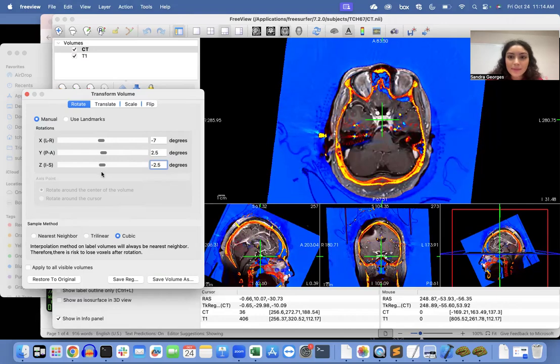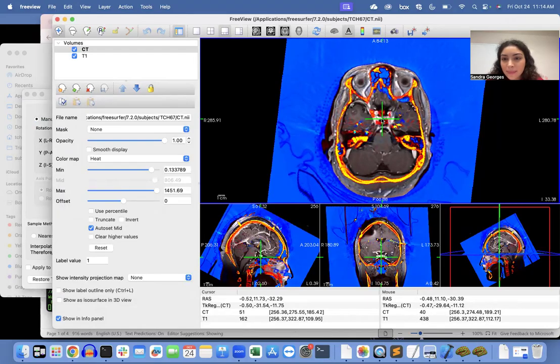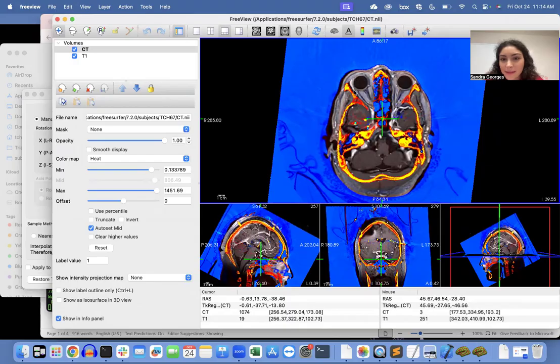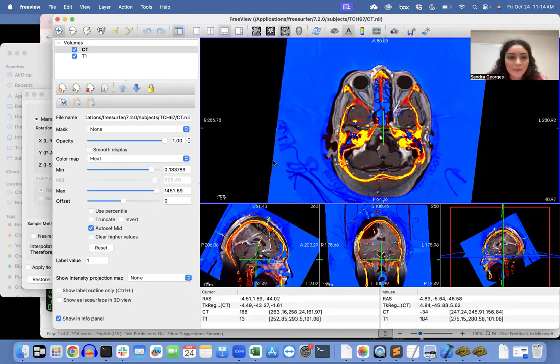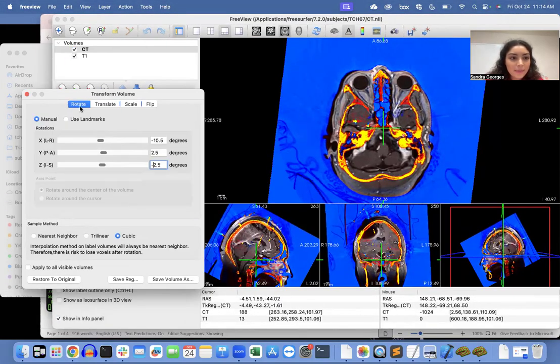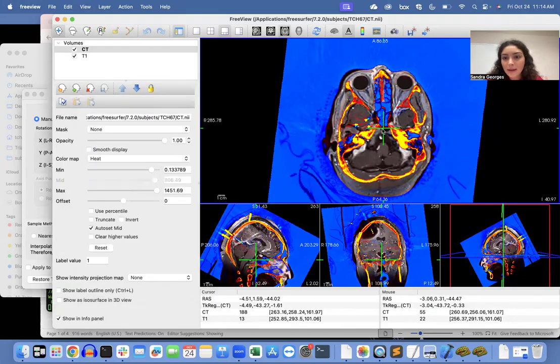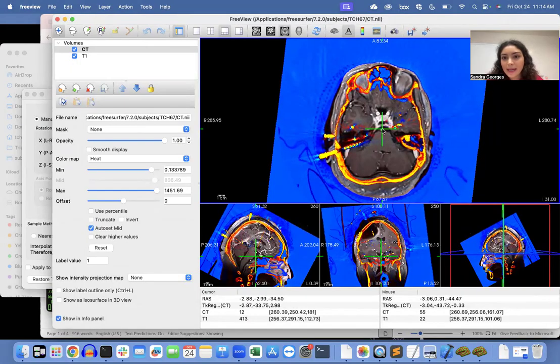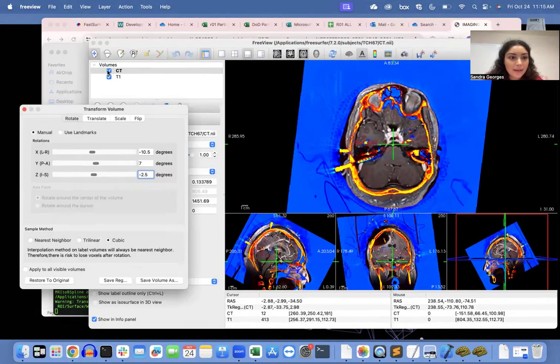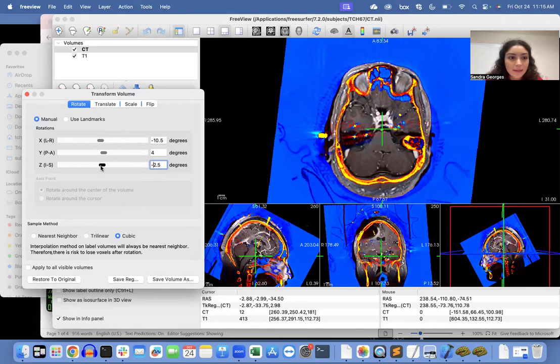So this will, again, take a lot of trial and error and some time. Still kind of off. See how there's some negative space here. The nose isn't in line, so I can move those around. Oh, still rotate. Should be more in the Y. Perhaps like this. That looks better already. Oh, but see how this one kind of starts a little bit sooner. So I think this is a Y problem, and it is.